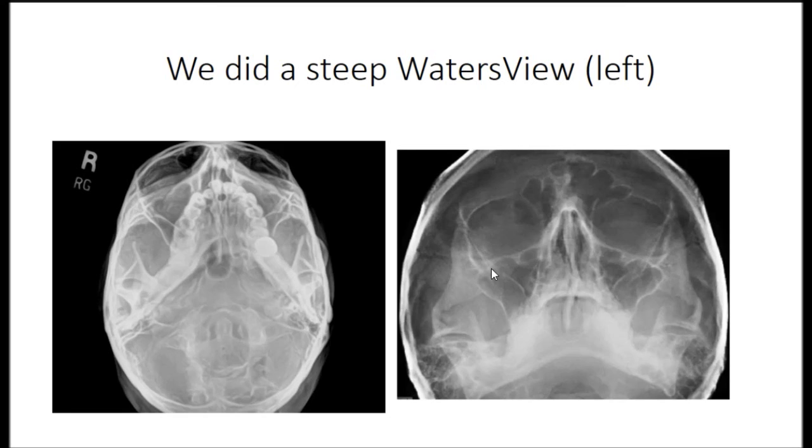Keep in mind, when we're using plain film here, the things that you're going to find, take them with a grain of salt. So if you are pretty suspicious for a fracture in a patient, you really need to do a facial CT. Just because you have a negative plain film exam does not mean that they don't have a facial fracture. So it has to really be correlated clinically. If we do see the fracture on plain film, that's great. You can treat it based on the plain film, but you can see there's a lot of overlapping structures here, and so our sensitivity is not near what it is on a CT examination.